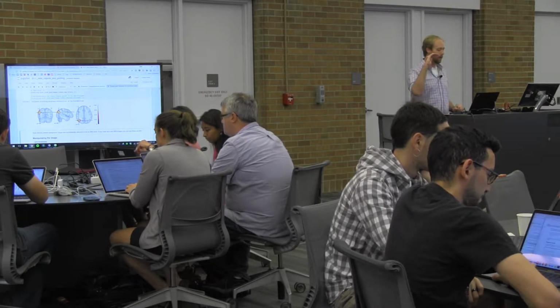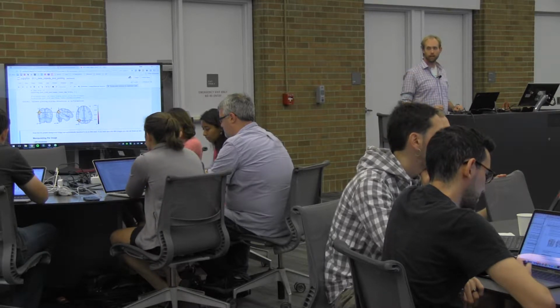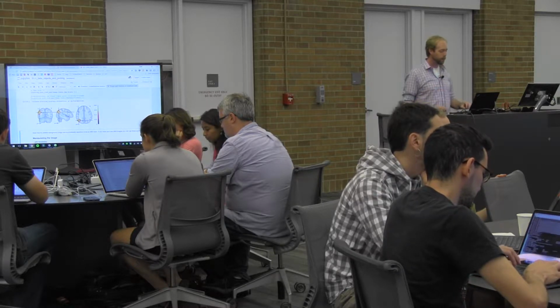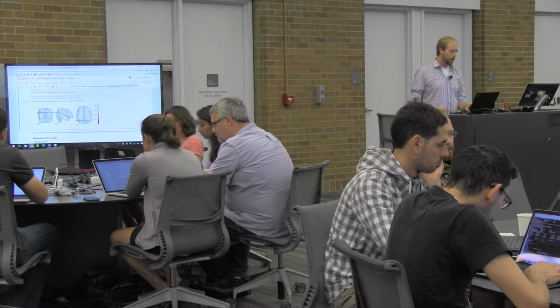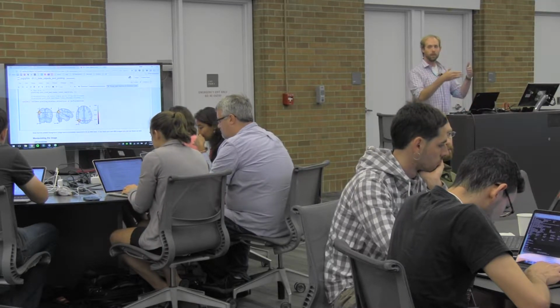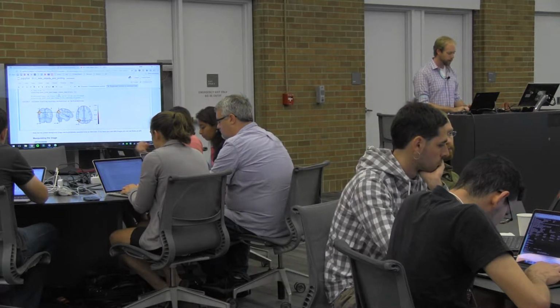In this case, each item in the stack corresponds to a different location that has been fit with this particular atlas. I think this is a functional covariance analysis that they did to try to define different subnetworks within the brain. So here we can see the 4th network that the atlas defines. And this viewer is a way that you can look at the same data from different angles very quickly. And I'll show you how to do that in a second.